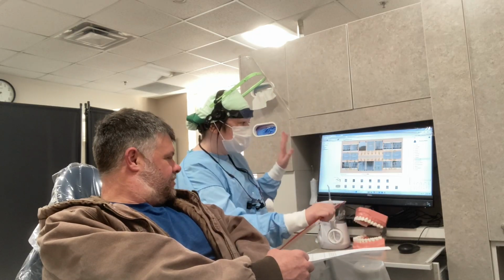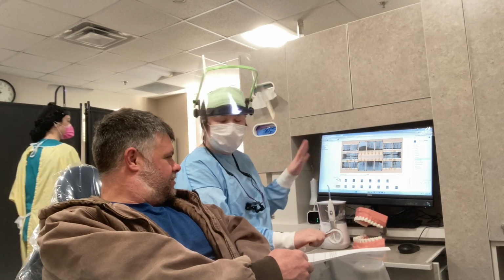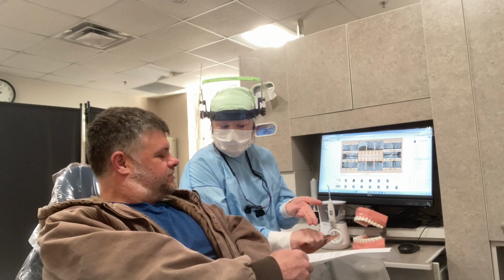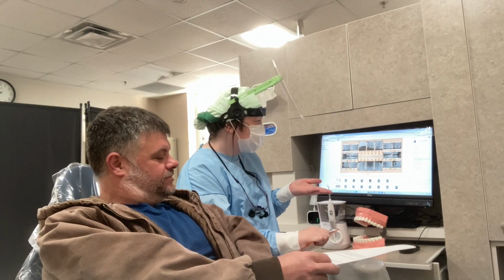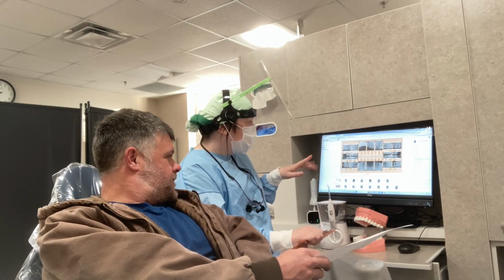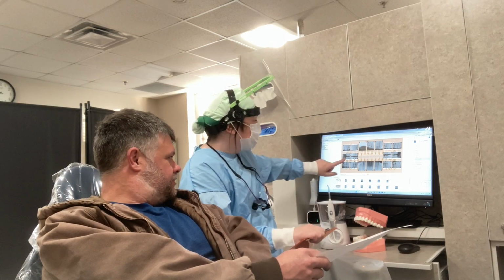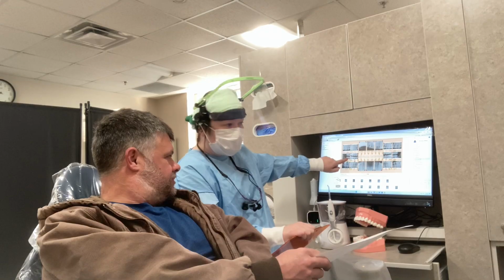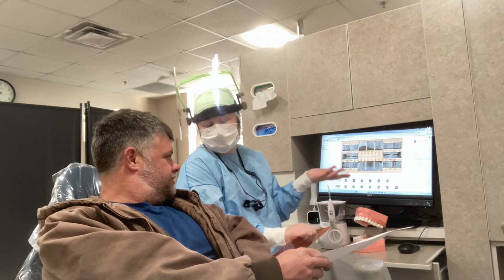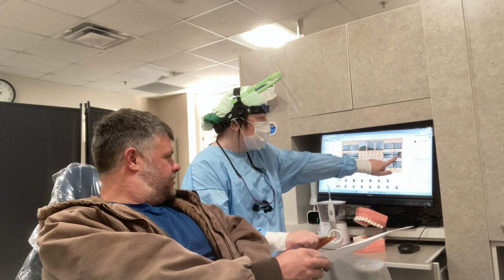Do you have any specific questions, like, hey, what's that? Or could that be a cavity, or anything that comes to mind for you? No. Okay. Well, the good news is there are no cavities based on what the dentist has diagnosed, so that's exciting. But some things I can point out to you are areas where you have had restorations or fillings in the past. Here's one right here. When we see that opaque area, that's going to be an amalgam filling, and I can confirm that because I saw it in your mouth too. We see the one over here, and then the one over here, on those molars.